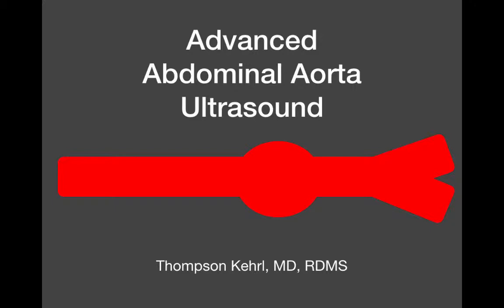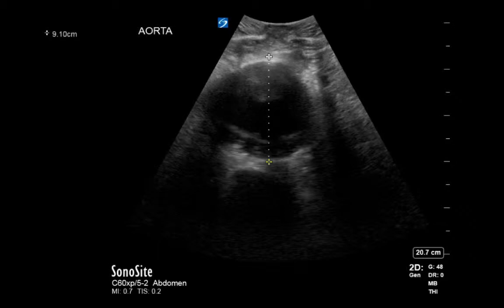We're going to get into some very basics and then delve into some more advanced topics later on in the lecture. So let's get started. I don't have any disclosures to make at this time. This is a scary sight. This is a big abdominal aortic aneurysm, over 9 centimeters.